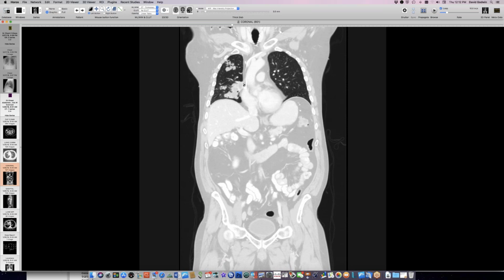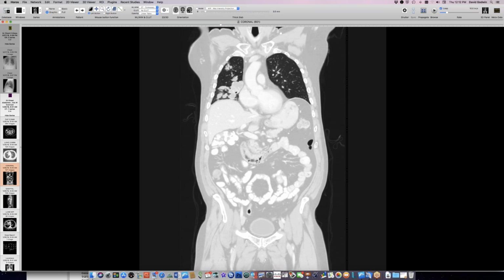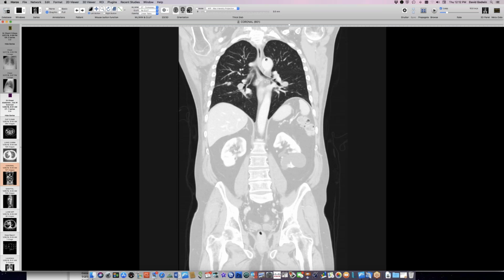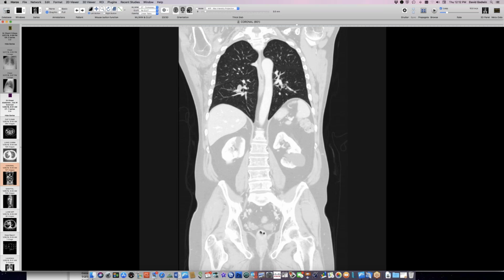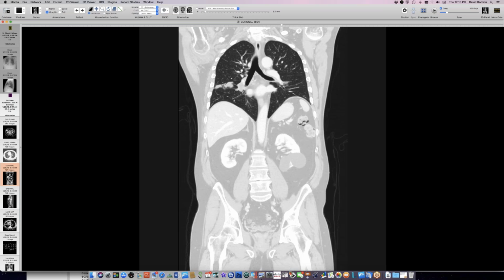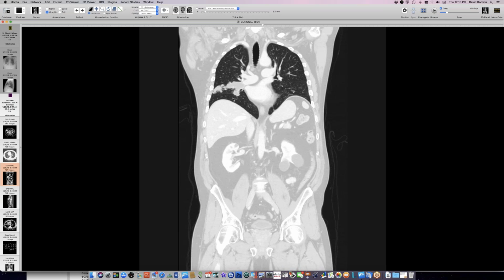And the succession on serial CT scans also supports that. We started out with these smaller lesions like these up here, and then things developed more proximally from those lesions. If there are big chunks, of course, they could lodge more proximally, so we have to consider that possibility too. But I don't think there was venous access for this to send big chunks to the lung the way, say, a renal cancer or hepatoma could do, or even an adrenal cancer that got into the veins. So, very large metastases here in an intra-arterial distribution.